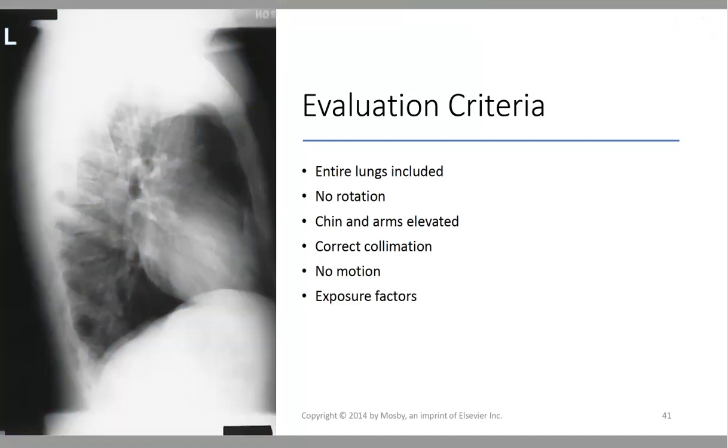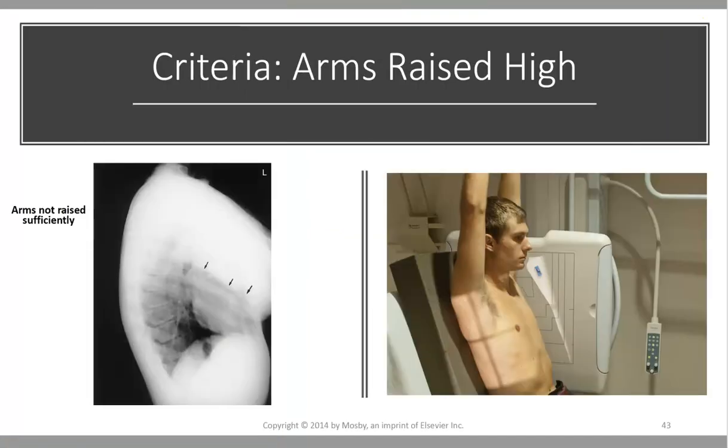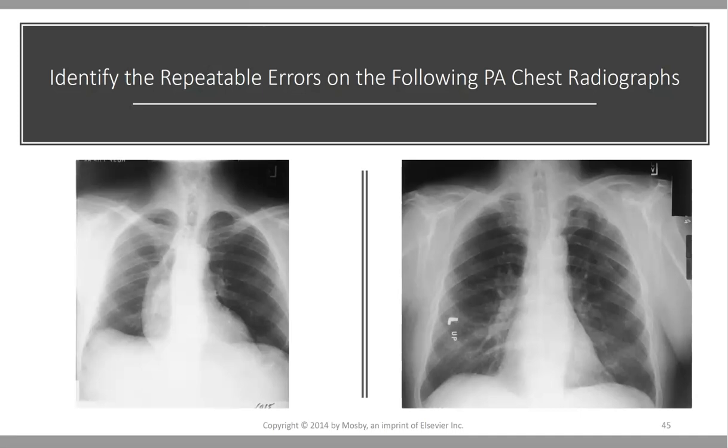Okay, I think that's about it. Hopefully your positioning lab can help you quite a bit to get these right. Take a look here. You can see some mistakes that we all make at one point or another. Even late in careers, you make mistakes.